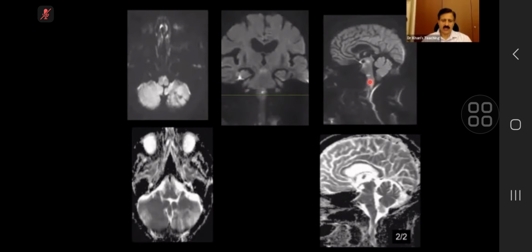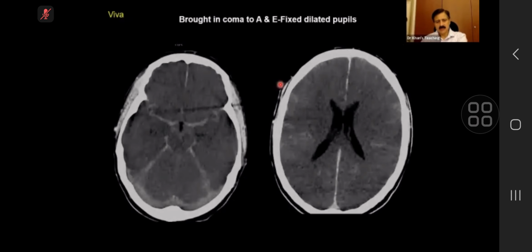And here on a sagittal, you see, look at this T2, ADC. So what I wanted to show you is 3-plane DWI. And some centers are using it as a standard thing. Last case of the day, and then we'll stop.